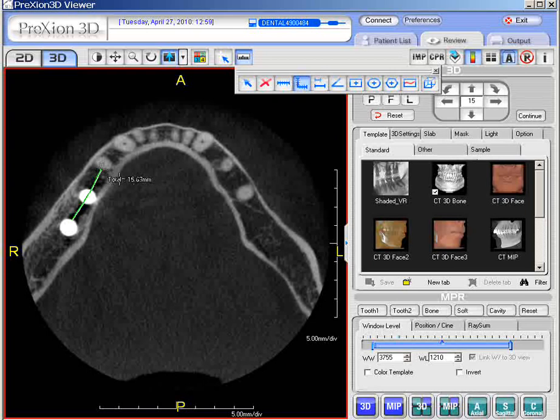With a double left click, we get a total of that section. And then when we click the total section, we can see the segments between each individual segment that we measure. So you have the ability to use the line segment if you want to use it in that regard. To delete it, right click it, and you're able to delete it very quickly.